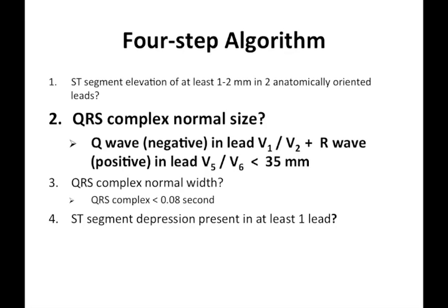If the answer to this question is yes, the QRS complex is normal in size, then you will move on to the next question. If the answer to this question is no, meaning that the QRS complexes are excessively large, then you probably have left ventricular hypertrophy, and we can no longer use this algorithm to diagnose STEMI.